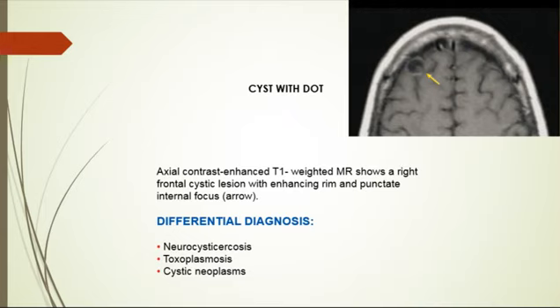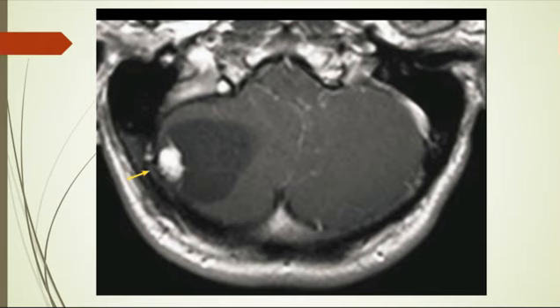So to differentiate, if the nodule is larger, it is more in favor of toxoplasmosis. If it is irregular with edema and enhancement, mural nodule, it's more in favor of cystic metastasis. Cyst with mural nodule, exactly. Cyst with nodule or mural nodule sign, okay? And in the adult, what about the child? The differential diagnosis includes hemangioblastoma, infection, and metastasis. It can be an astrocytoma in children, in the younger age group. However, obviously this is an adult, okay?